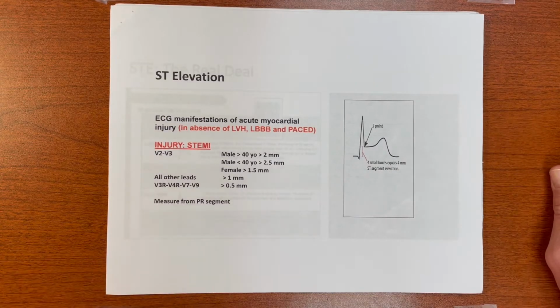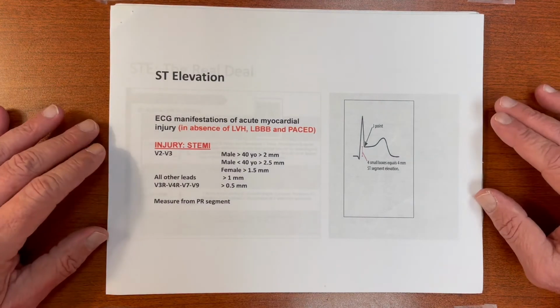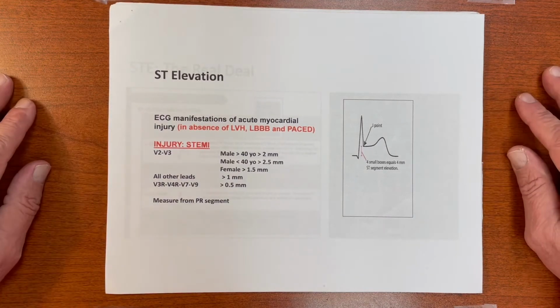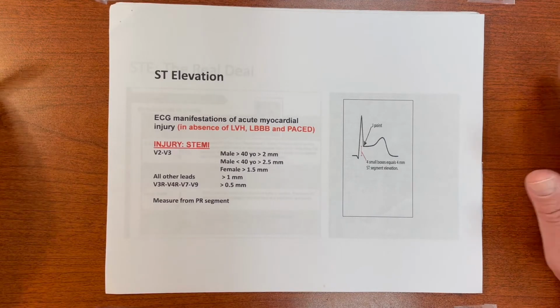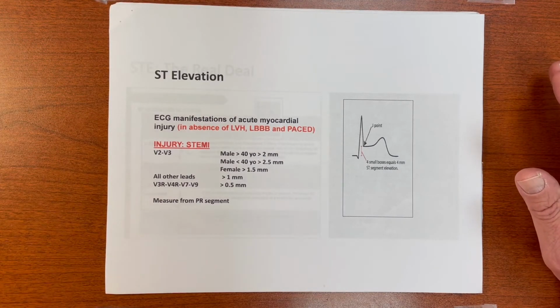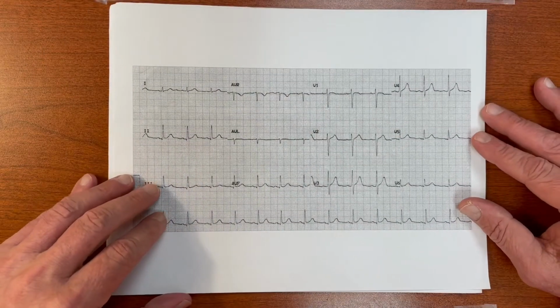So we're going to talk about ST segment elevation now. This is an injury pattern. ST segment elevation infarction, that's what we're after. Now, along with what we've talked about before, the notion that there are normal and abnormal reasons to have ST segment elevation, I would like to point out, before we start here, by looking at a normal EKG.